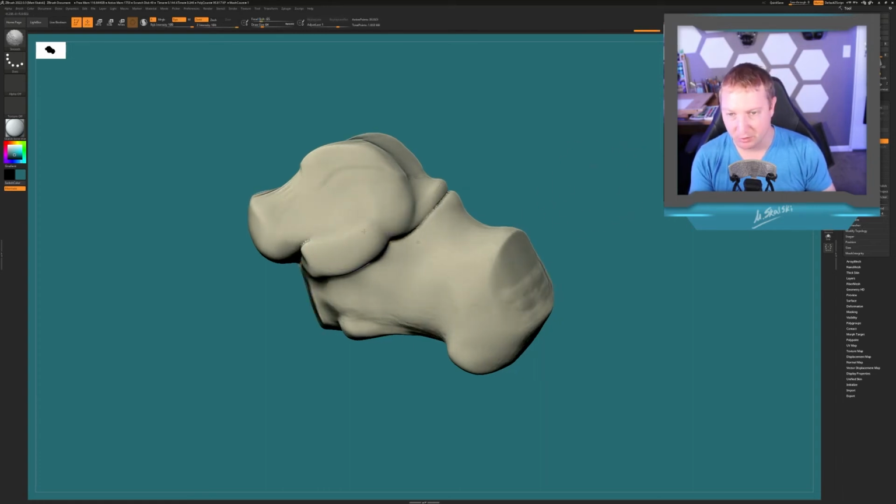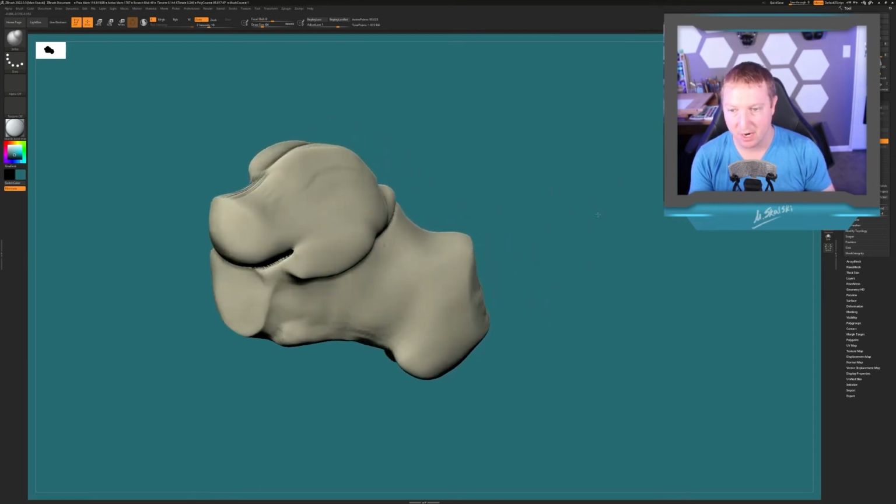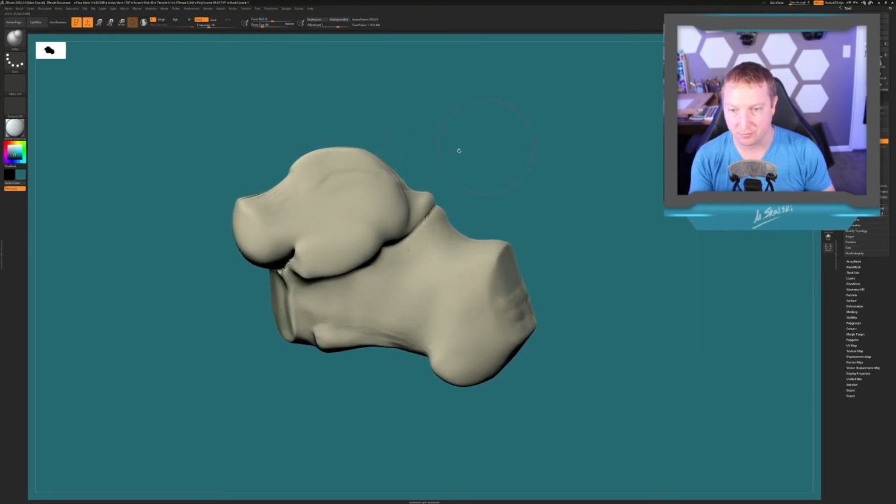And now let's smooth this out a bit. And so now you can see that we're going to have one continuous C the full way around because we've fused up this middle facet of the subtalar joint. And that's going to create this continuous C sign on the radiographs. So hopefully that was helpful and helps you understand subtalar coalition a little bit better.